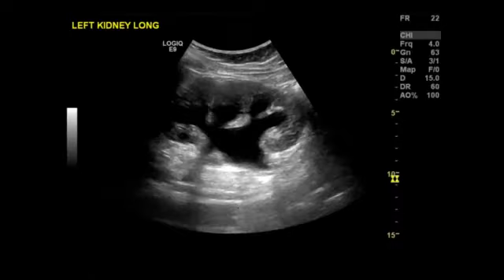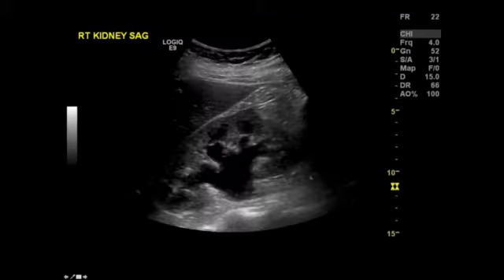This is now moderate, where we've still got nice renal cortex, but we've got clubbing here of the collecting system. Some people might say this is moderate to severe because maybe there is a bit of thinning of the cortex there. It's certainly a scale, and some people are better at it than others, but we'll go for a moderate here. And here again, a moderate hydronephrosis.